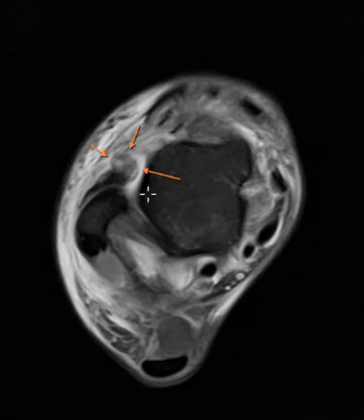Usually they're a lot harder than this because they're not balled up. They're usually just thickened, or it's hard to see. This is a clean-cut case. This is the posterior talofibular ligament here. It's almost always intact, and it's broad. And this is the one that's torn typically when there's a lateral ankle sprain. So this is just one part of it.